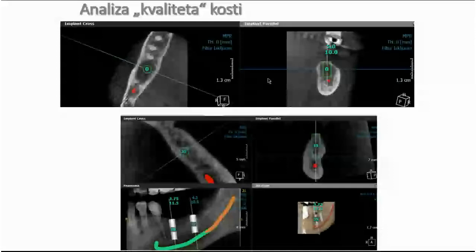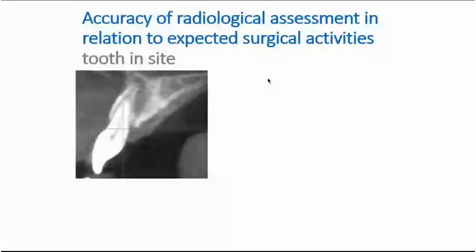If we use implants with a high torque insertion rate, then we will probably do great damage and probably cause implant failure. Or we should talk about implants which are inserted without torque, which are just put in the position, as the ones we had the opportunity to see planned in our previous action inside of the software.